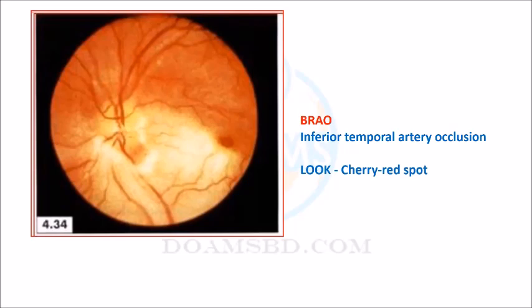Not but orocutaneogenital syndrome. Oral, cutaneous, genital syndrome. It is very part 1 information, just for understanding. But in the part 2 information to diagnose Behçet's disease, more often it is found in the exam by these vascular phenomena, iritis or this vascular occlusion, maybe underlying disease, we don't know. We could identify many reasons for this vascular occlusion. This is branch retinal artery occlusion.